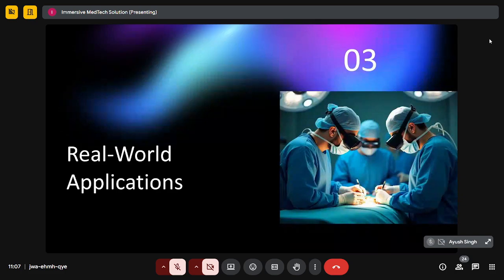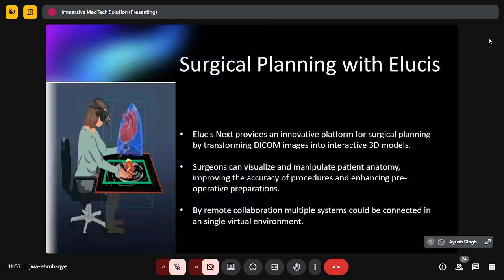Now, let us look at some real-world applications and how it is currently being used for 3D surgery. Whenever we are working on any data set, we can either use it in a text view, or whenever we go into VR, we will have a particular ghost view of the same while we are doing the segmentation. So the segmentation accuracy is the most precise.